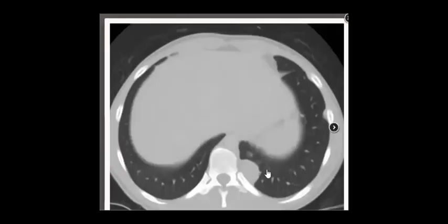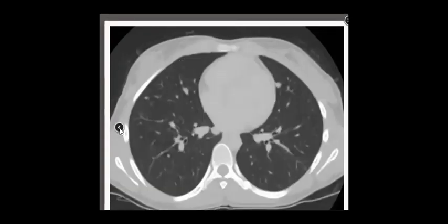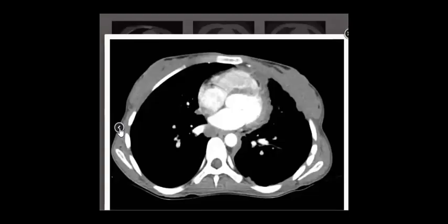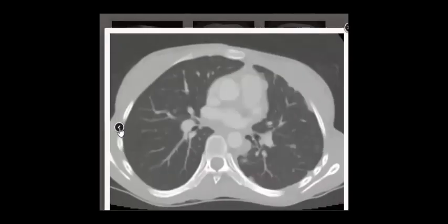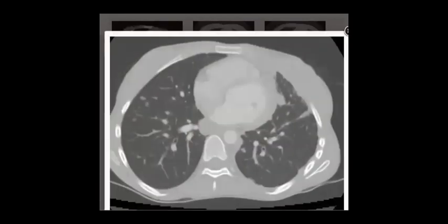So what is your thinking now? And one of them was this one. So if we go to the first image, okay. Let's just stop here before we go. What do you think about this image?